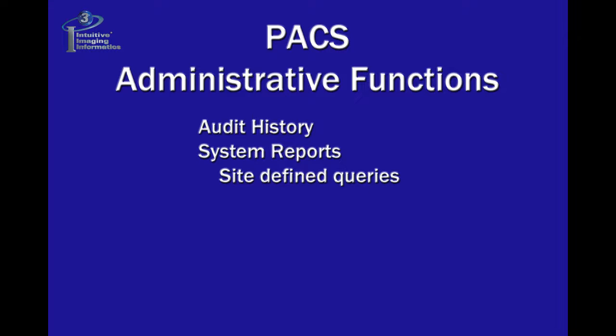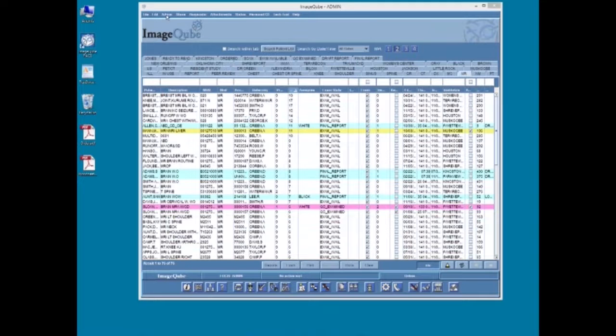Users may also create system reports based on site-defined queries.